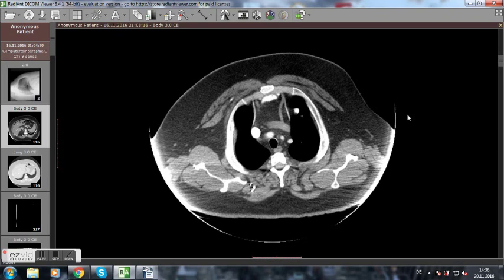Here is the right side of the patient. That's the left side of the patient. Here we have the upper side of the patient. And here is his back side, on which he is lying. The CT appears in black and white, which represents the different densities of the anatomical structures. So black represents the lowest density and white represents the highest density.